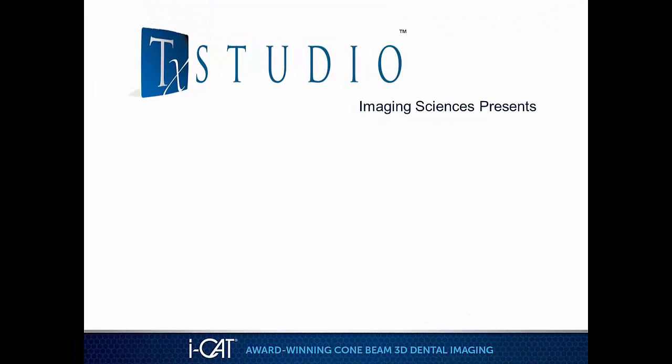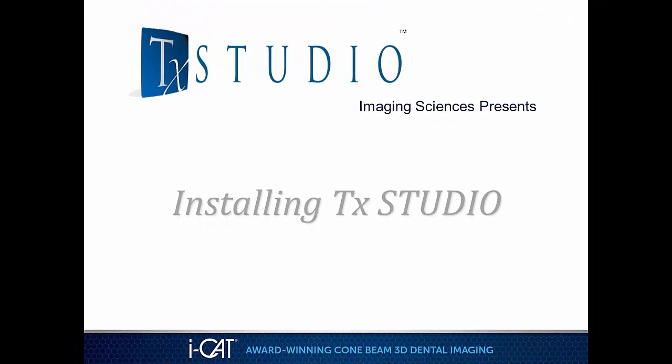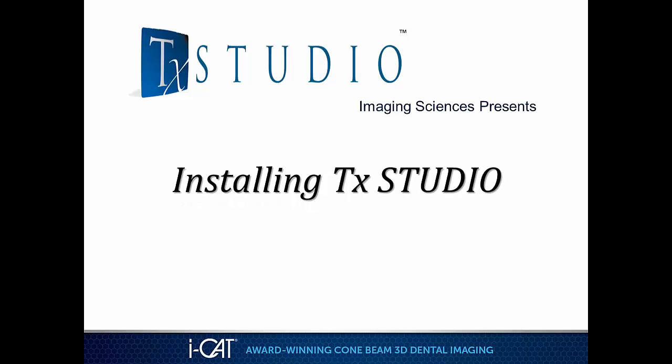Welcome to Imaging Sciences Treatment Studio software installation tutorial. During installation of the Treatment Studio software, there will be a system check of hardware and software components.